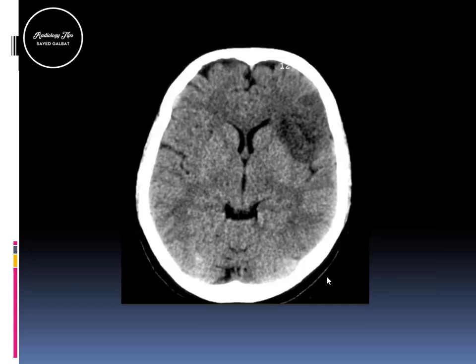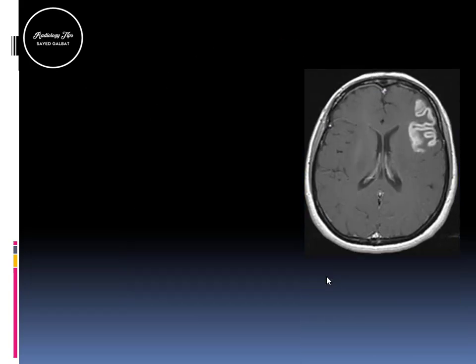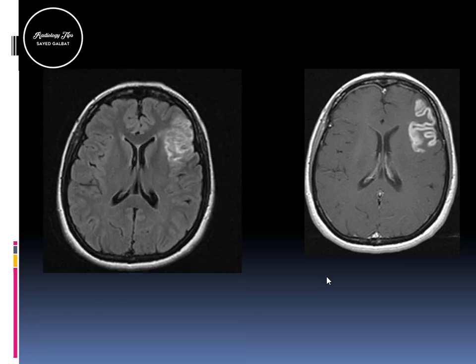Okay. So the patient did a post-contrast study. This is an MRI. So what's this pattern of enhancement? The gyral pattern, which is classic for the subacute stage of an infarction. And also in the FLAIR weighted images, you can appreciate these abnormalities, and it's not always there. Maybe you will see it in the post-contrast study only.